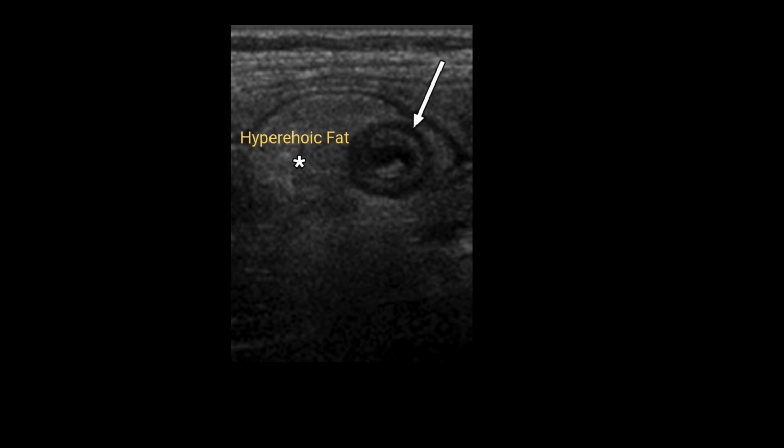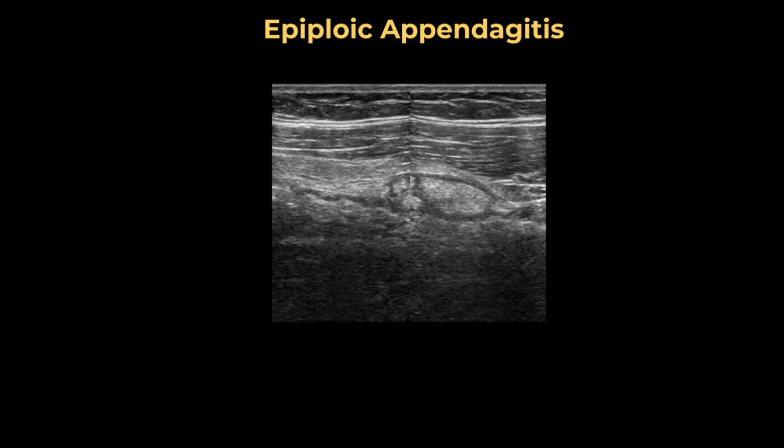Vascularity is usually minimal or absent in the lesion itself. Sometimes a thin rim of increased blood flow may be seen in the surrounding tissues. The lesion is a firm, non-compressible oval mass. Luminal content is normal. Gas and stool pass normally through the adjacent bowel.